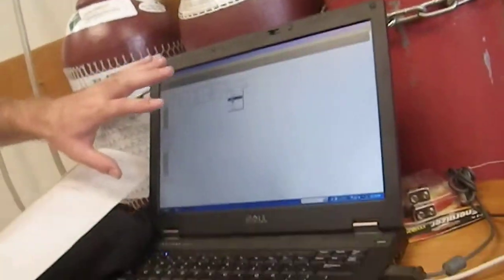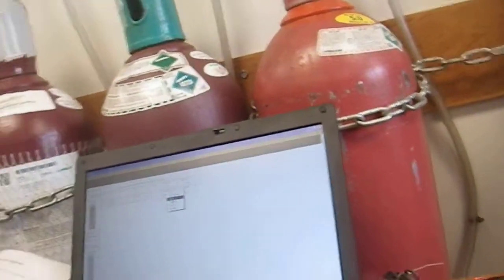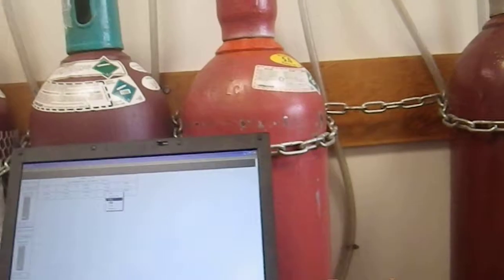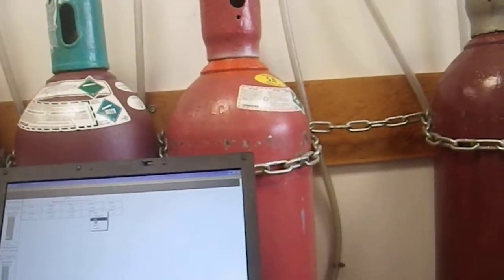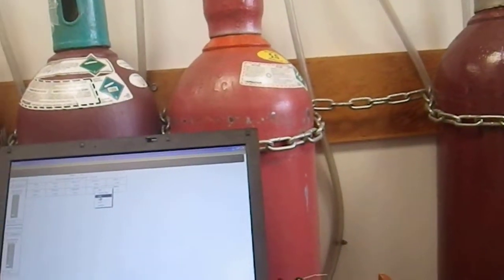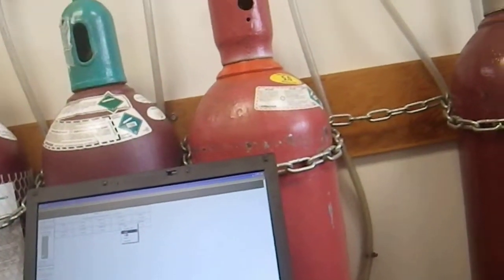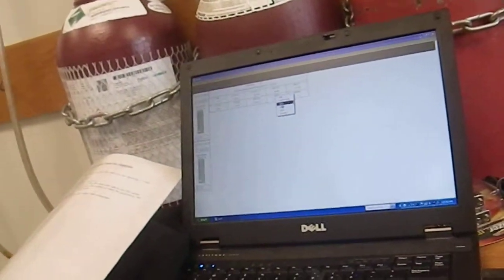This is if you have like 5 people in a day and you just want to go through it. Otherwise, you have to close the program, open, repeat all this stuff. This way you can just go close, playback, deselect log, reselect log to get your new file, and just go through it. It saves a lot of time. But it'll work either way, whichever one you're more comfortable with.